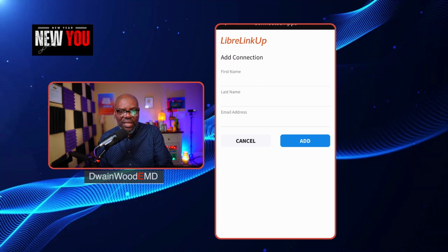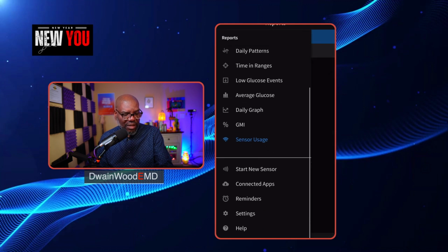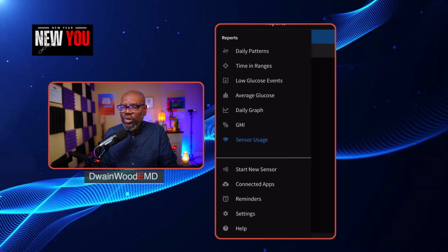And then once they say yes, then it will instruct them on what they need to do. Okay. So I love that feature. We actually use that feature quite a bit for patients who we see in the office, or clients that we see. Then they can connect their data to me without them having to physically be where I am. Or when patients are coming into the office, we don't have to actually take their meter. They just say, hey, I've been uploading. We go into the cloud, we pull it down, and we can get that information.